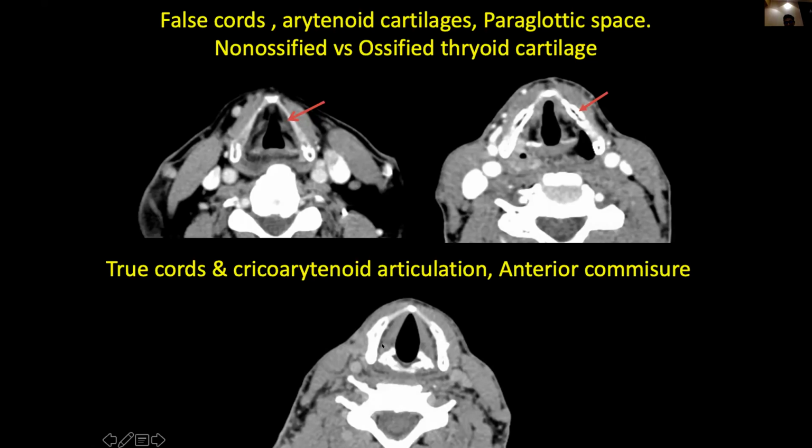The moment you see the vocalis muscle, which is taking origin from the cricoarytenoid joint, this is the arytenoid, this is the cricoid. The cricoid is over here. This is the arytenoid. This is the cricoarytenoid joint. The cricoarytenoid joint is giving origin to the vocalis muscle. It is inserting anteriorly into the anterior commissure. The anterior commissure is the part where the muscle inserts and the perichondrium is deficient. This becomes a gateway for the disease to spread very rapidly if there is anterior commissure disease.